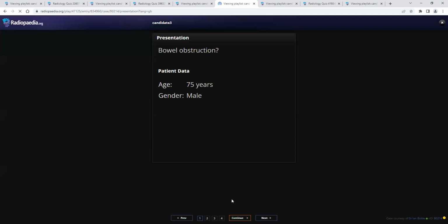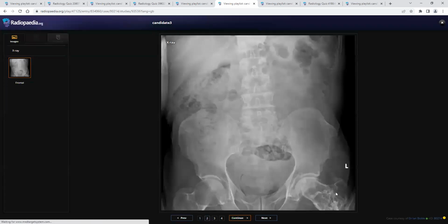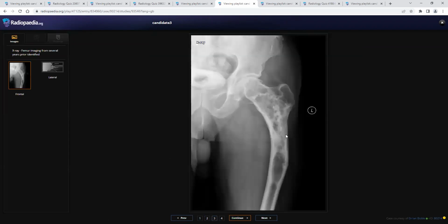And this, again, you picked it very well. This is the bony abnormality at the edge of the film. In one or two cases you will get an abnormality at the edge of the film. You should see everything in the film and come to the diagnosis. And this is a case of fibrous dysplasia. Fibrous dysplasia can happen at elderly age also. There is no age bar. As you were right in telling, Paget's is also in the differential diagnosis. And you should see whether other bones are also involved in the body or not.